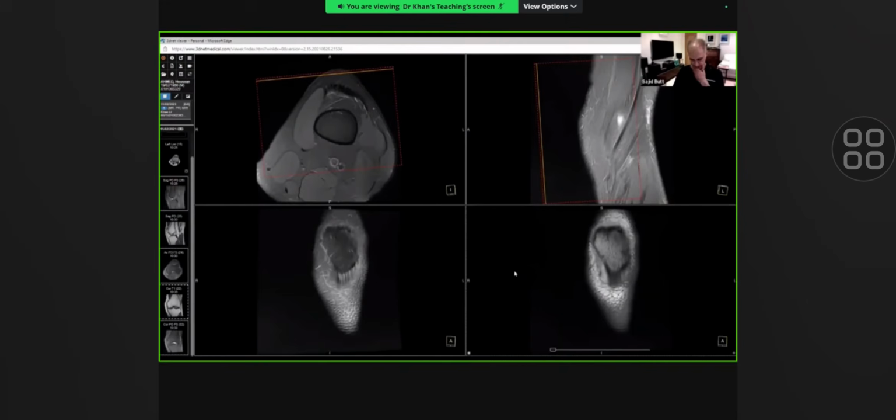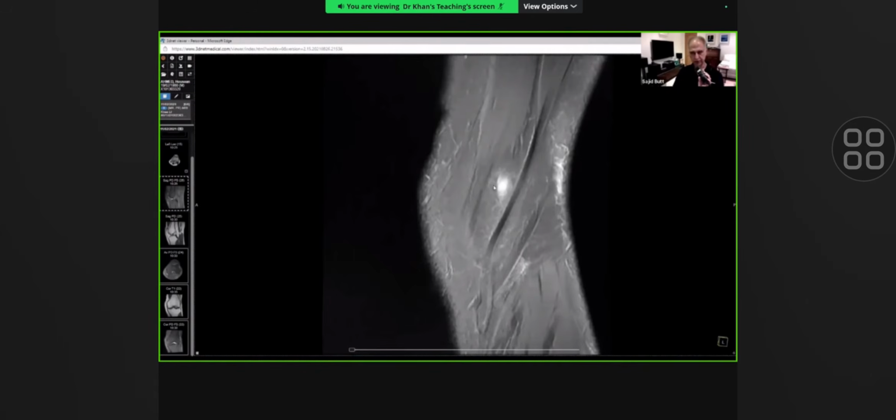Okay, so this patient is a 40 years old male patient. He has got a 1 year history of knee joint pain. And he says that the knee can go out. These are the patient's own words. So we're going to see what the examination shows.